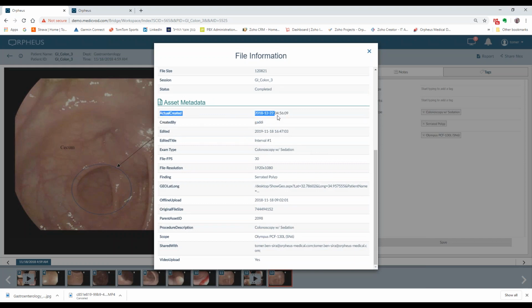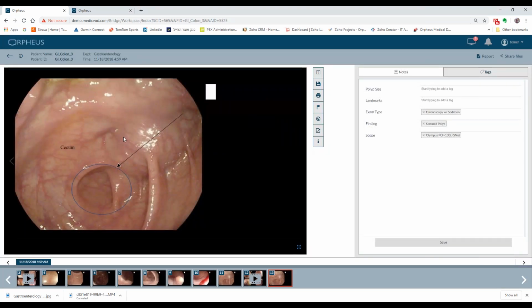You can see how we actually maintain the information related to the original. See, this original file was created in December 2018 by a person named Gotti. But it was edited just now, with this time. So this is the image. Any image that's created like this also inherits any other metadata that was part of the original image. If that makes sense. A couple more things I want to show you.